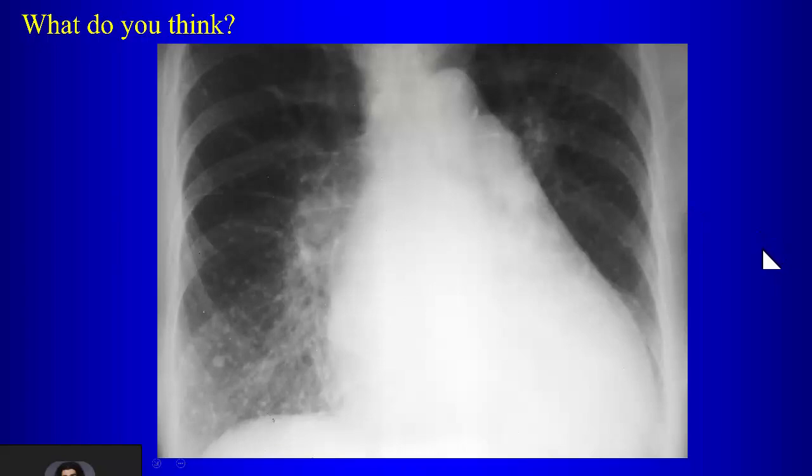Now there's another finding when we look at the lungs. What do we see? Yeah, there's these calcifications here in the lungs, these round calcifications, right? So how do we put this together with the heart disease? What's going on? Well, it's not embolization, no. So these are pulmonary ossifications associated with rheumatic heart disease.